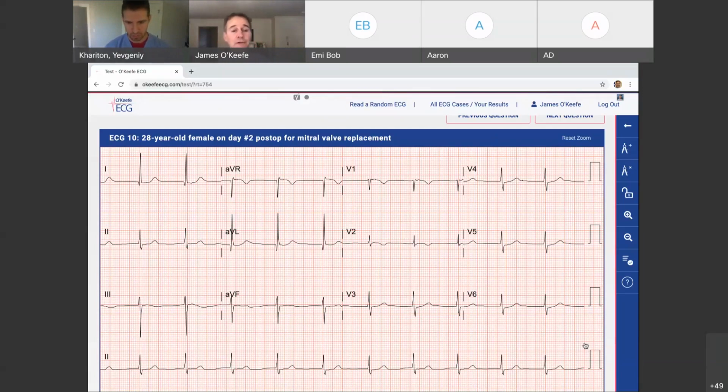And for the ventricular rhythms, you don't call the axis, you don't call the voltage, you don't call infarcts or Q waves or anything. You just call VT or accelerated idioventricular rhythm or ventricular escape rhythm. But yeah, this is an accelerated junctional rhythm, often seen early post-operative for heart surgery or sometimes with digitalis toxicity, electrolyte abnormalities, various things. But yeah, there's no P wave visible.